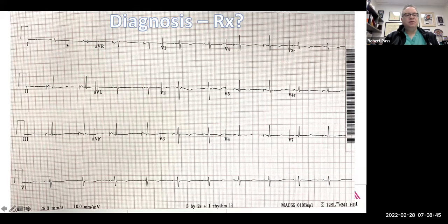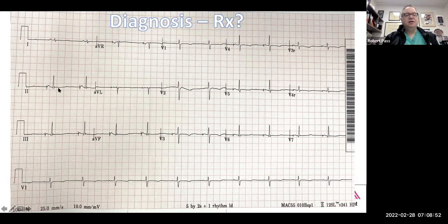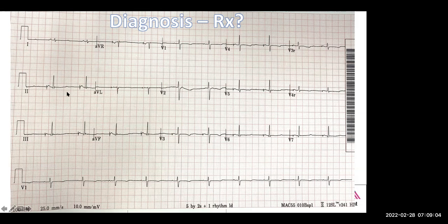Or this one here? Sorry, I can't see. What do you think about the position of the T wave in relation to the QRS? This isoelectric period here. So normally you say that if the QT itself is more than half of the RR interval, it's roughly a sign of long QT.